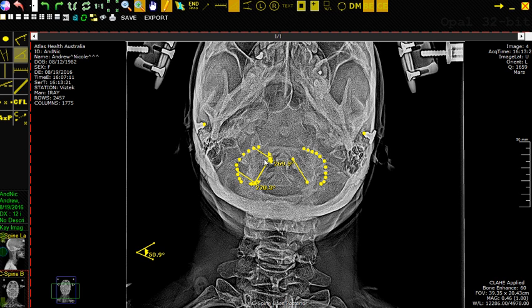Now what you can probably see is we're trying to make a box. So we've constructed anterior point 1, we've identified anterior point 2 by drawing this line perpendicular to this line here between anterior 1 and posterior 1. And then we've just done posterior 1 to posterior 2.